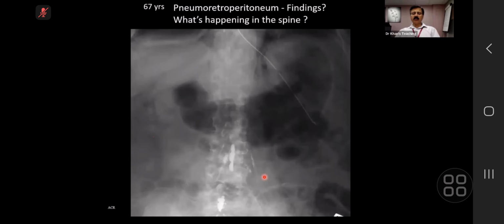In that era, we used to do myelograms with a contrast agent, which was known as Myodil, and it could stay there forever like this, and there was a lot of toxicity, etc. Please remember that these patients are still around; they are still alive, and it's quite an Aunt Minnie type of appearance. Nothing else can give you this kind of appearance.